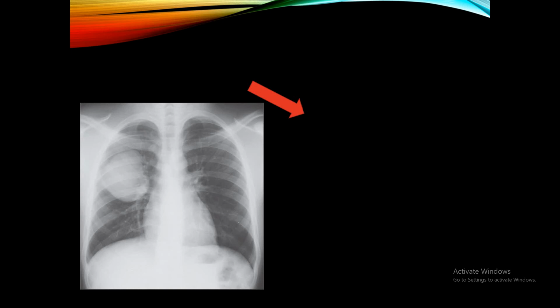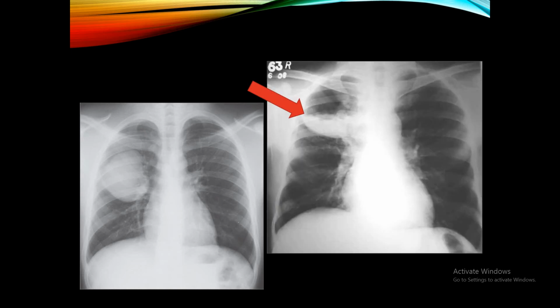نبدأ بأسهل الفيتشرز of bronchogenic carcinoma اللي هي lung mass. مثل ما تلاحظون إنه this chest X-ray containing very large lung opacity اللي هي in the right upper and middle zone واللي هي lung mass, and this is mostly bronchogenic carcinoma. We should suggest the CT scan to exclude the bronchogenic carcinoma. يجب أن نتذكر دائما أنه chest X-ray modality لها محدودية، مثل ما كل فحص بالدنيا له حدود معينة. فبتشيست إكس-راي ما نقدر نفرق بين الماس السوفت تيشو وبين الفلويد.